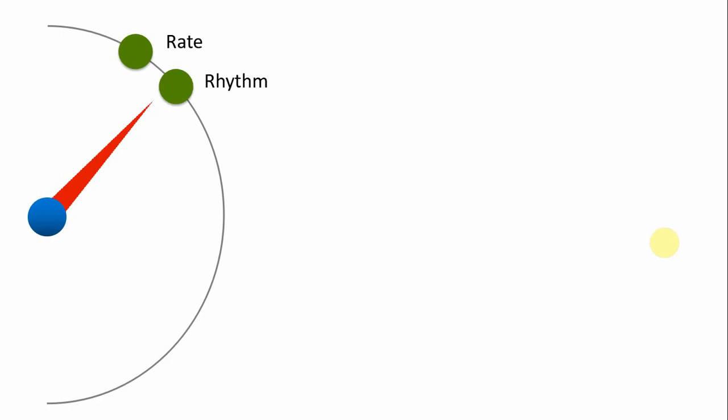Is there any atrioventricular dissociation? Is every P wave followed by a QRS complex? If there is a happy marriage between the P wave and the QRS complex, that is sinus rhythm. Once you are happy with the rhythm, whether it is regular, irregular, sinus rhythm or not, then let's look at the axis. For axis, look at lead 1 and AVF.